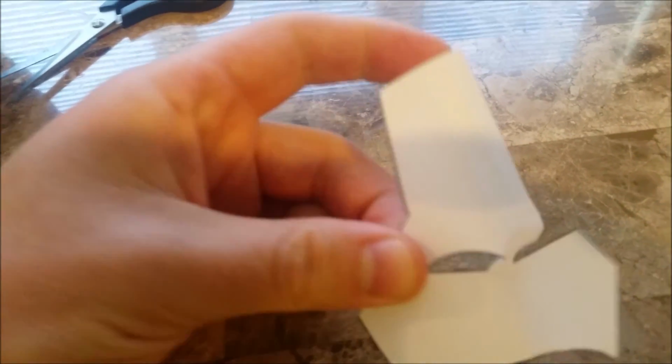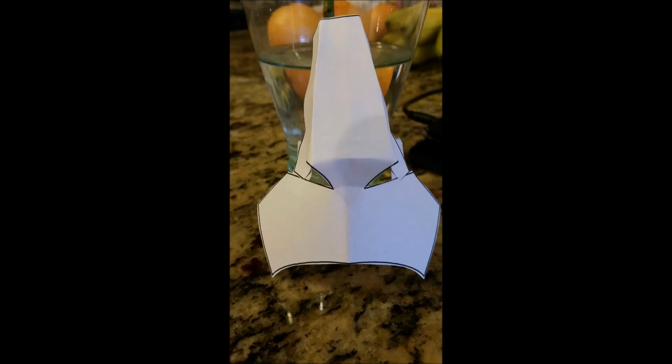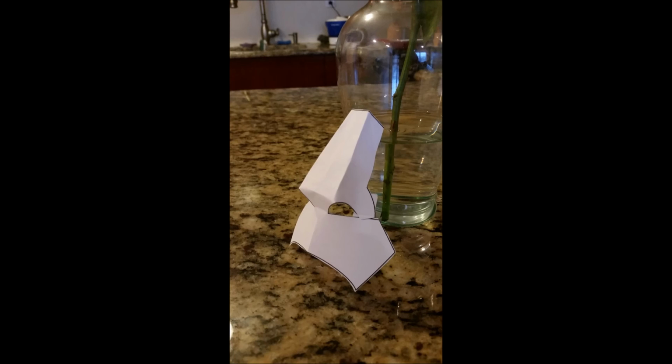So this is why this is a good method, because you convert the 2D into a 3D model. And I'll show you the finished product now. So this is the final model, and you can see how it looks, and it gives you a projection.